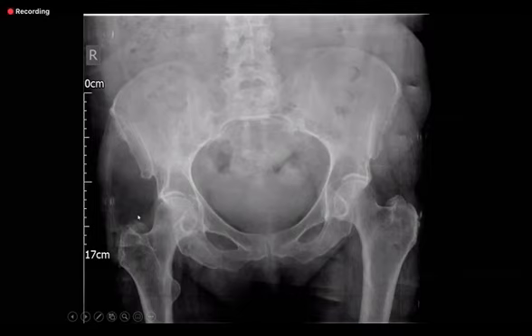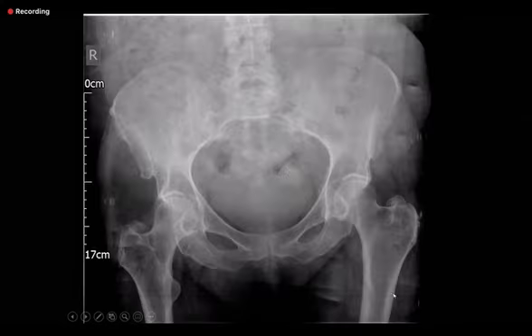Now there is a lesion, very difficult to see, but when you look carefully, look at this. This is low density. Lipomas, please remember, have come in even rapid reporting, so the key thing is that you will see low density on a plain film.